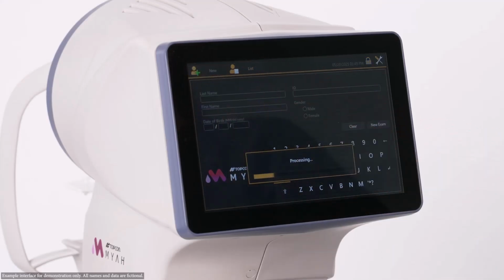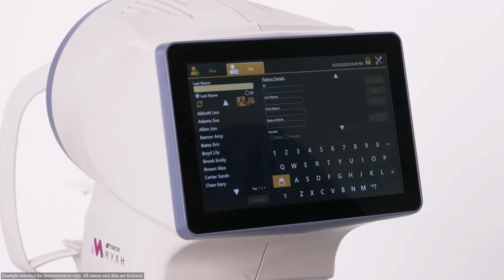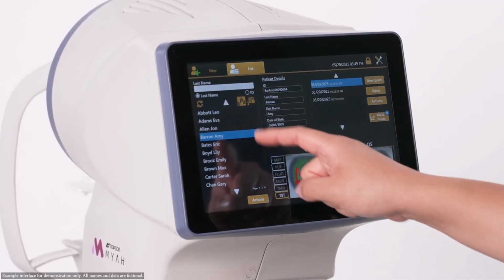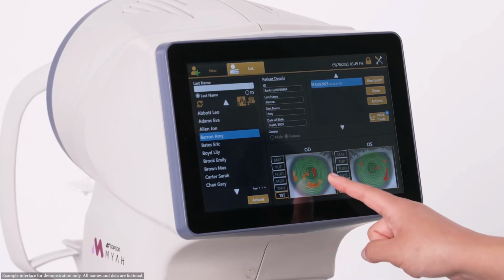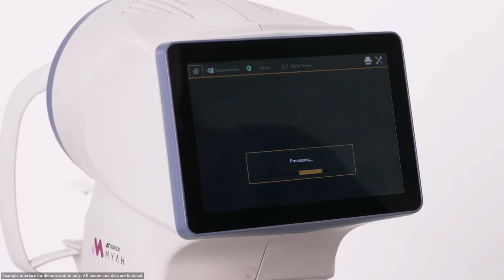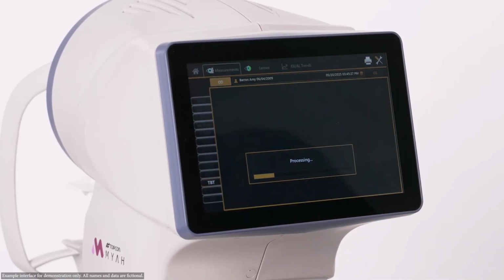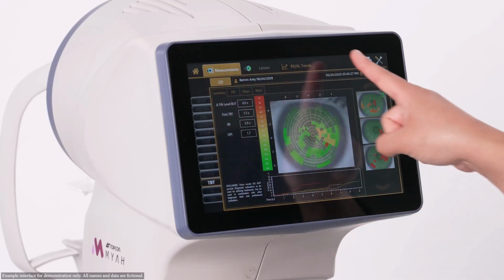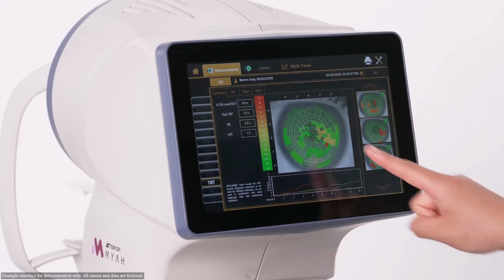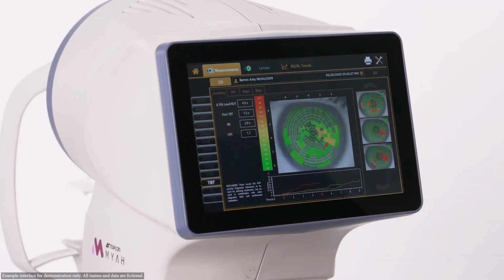Either select the TBT tab on the measurement screen or select your patient and the correct exam date from the home screen. Tap on TBT and double-click the exam thumbnail for the eye you want to review first. Select OD for right eye data and OS for left eye data. There are 4 tabs near the top of the screen: Summary, TBT, Maps, and Blink.